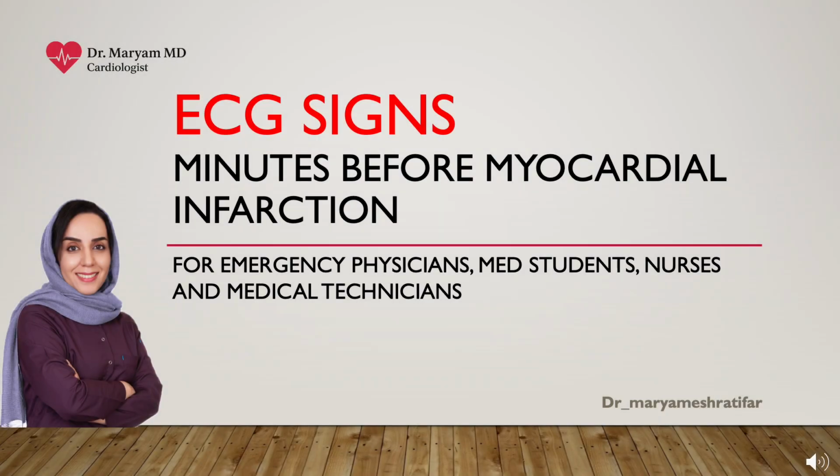Hello, everyone. I'm Dr. Mariam, a general cardiologist, and today I want to review an ECG with you that shows early warning signs before an acute myocardial infarction. Unfortunately, I've noticed that these findings are sometimes missed in the emergency setting, even though recognizing them in time can truly save lives.